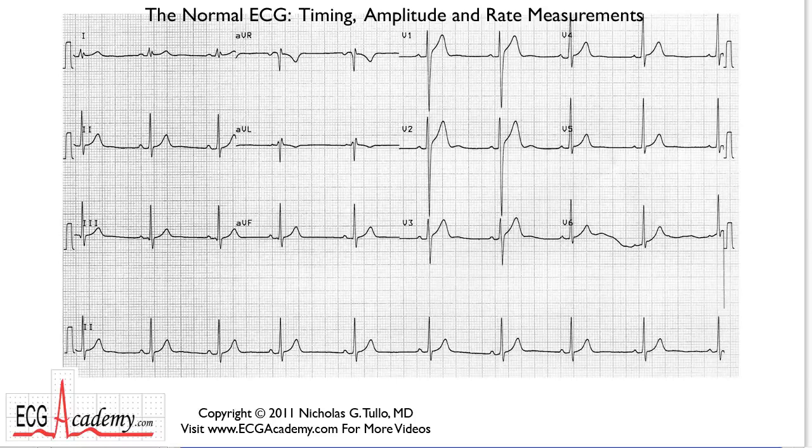Hi, this is Dr. Nick from the ECG Academy, and we're going to continue this discussion of heart rate measurements. We're going to pick up where we left off with the last tracing.